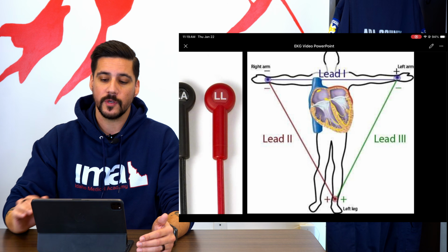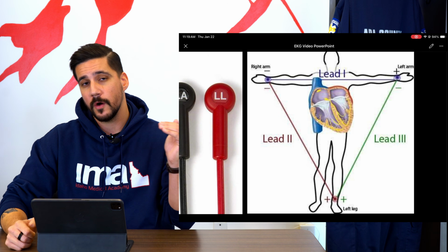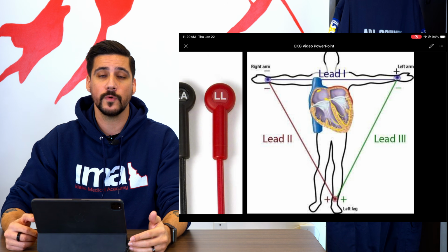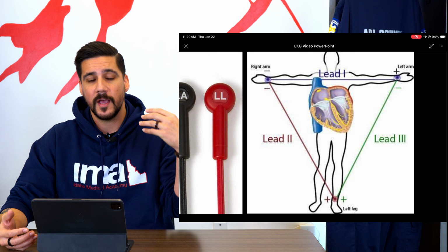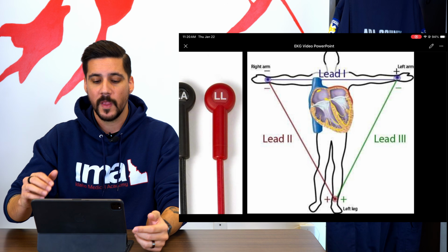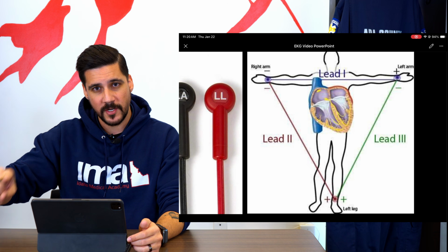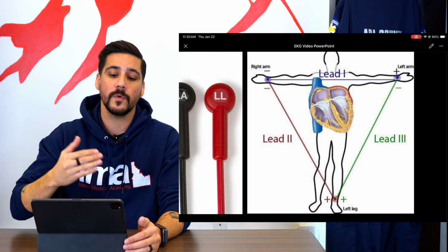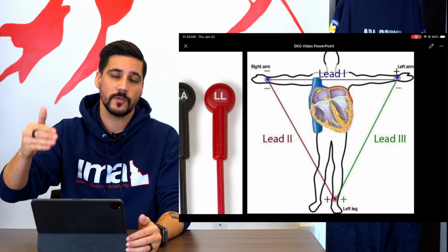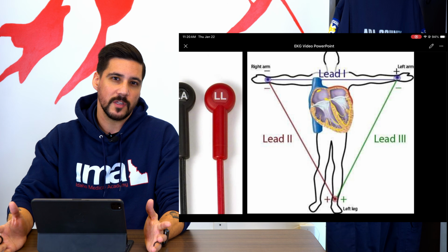And the reason we do so, as you can tell from this diagram, is that the negative to positive is always going to be the flow of electricity, and that includes the heart's electrical pattern. So normally, if you know the SA node to the AV node to the bundle of His to the Purkinje fibers, right? The electrical activity of the heart runs from patient's right to patient's left, okay? And so that's why we read this lead, because lead 2 runs electrically from patient's right to patient's left. So it kind of follows that along, and it just gives us the clearest view.